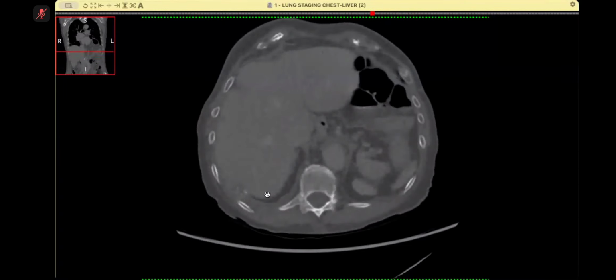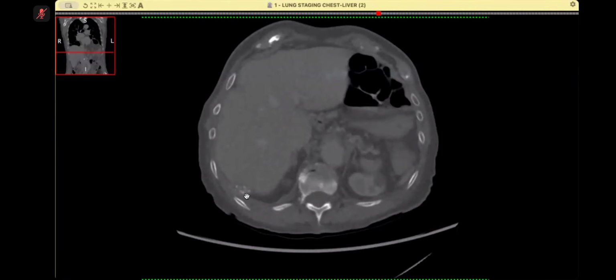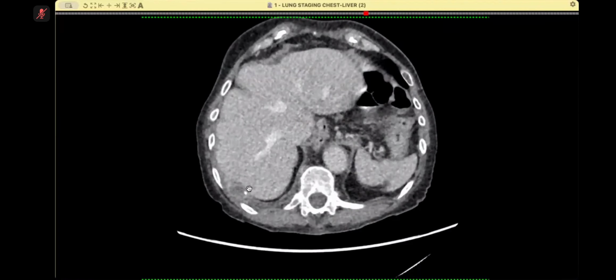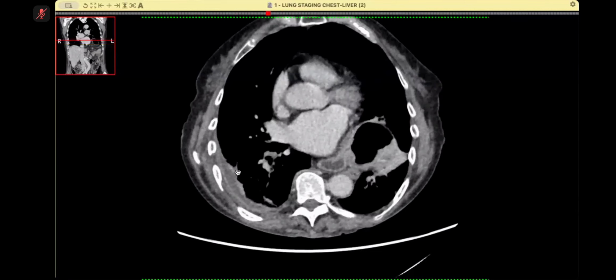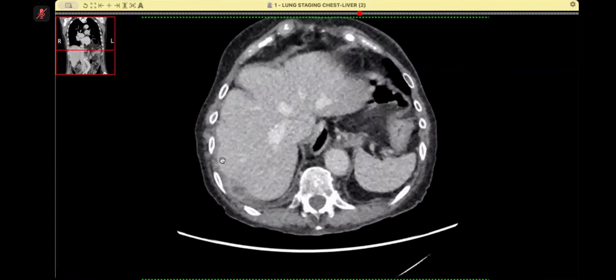And then look at these ones. There is nothing else in the world which can explain this. How many of them are there? Just think as if the gallbladder is sitting here, and they have caused this chronic inflammation, and this inflammation has gone into the chest. Simple as that. And initially on this CT, actually the diagnosis was not made.